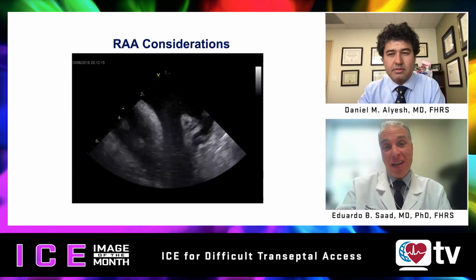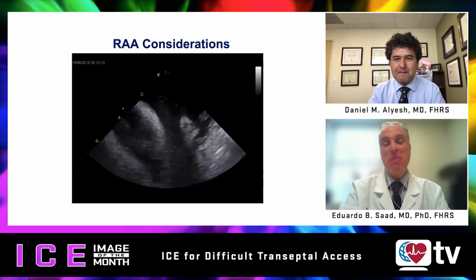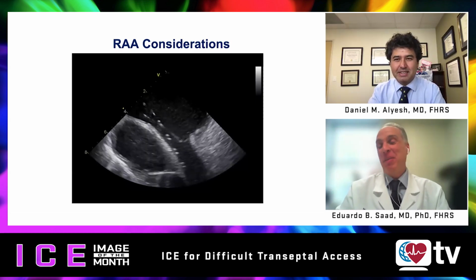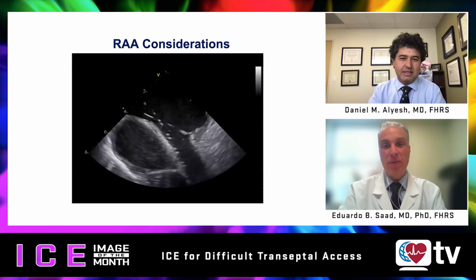I will go beyond that. If you're into doing fluoroless pacemakers, that right atrial appendage view is awesome for putting the atrial lead in with ICE guidance. But it's just a multitude of uses that you can have with this image.